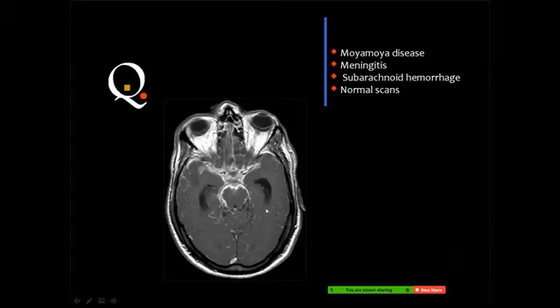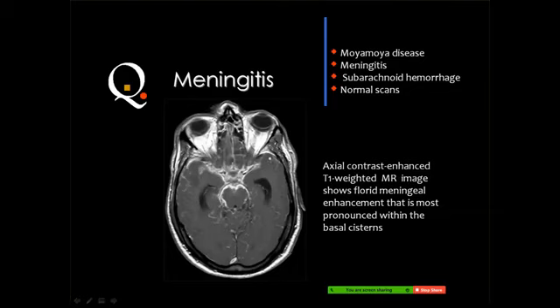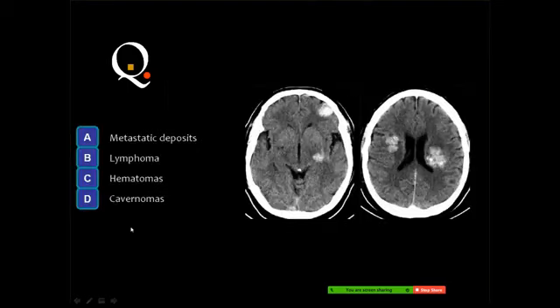Moya? This is contrast enhancement. Meningitis. Yes, basal meningitis with enhancement of the basal meninges. Maybe tuberculosis, maybe other etiology, but meningitis is the right answer.